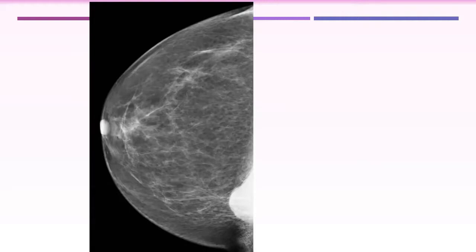You said it is a circumscribed mass. Yes. Could you see the deep portion of the mass? No. So it is partially circumscribed. The visualized part of the mass appears to be circumscribed. As radiologists, we have to describe what we have seen. So it could be a high density mass projecting over the pectoralis on the medial aspect of the breast. Differential diagnosis includes sternalis muscle as a variant.